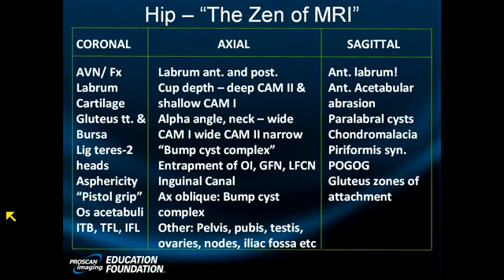Patient's age, 40. Pretty good playing softball at 40. So I'll bet everybody's interested in this abnormality posteriorly, aren't you? The T2's on the right, the T1's in the middle. If you were looking at a brain, you would say methemoglobin staining around the outside, not so much on the inside. You might call it a subacute hematoma, and you'd be right.